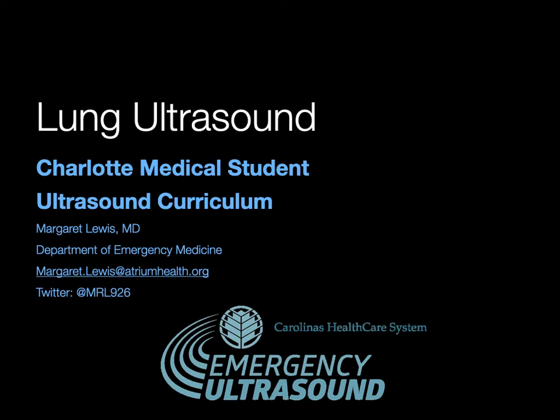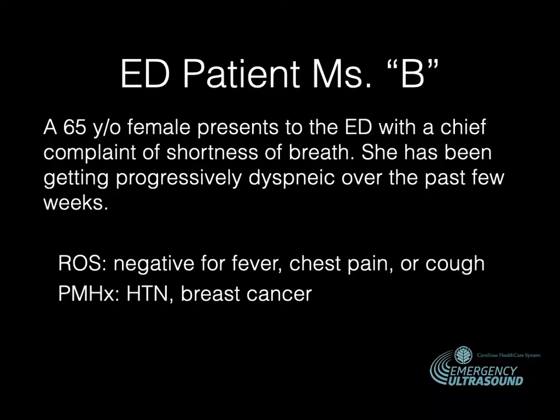Hey team, this afternoon we're going to talk about lung ultrasound. Now, generally we consider air is the enemy of ultrasound, but when it comes to lung ultrasound, we can rely on the artifacts to look for different findings that represent pathology. Let's start this one out with a case.